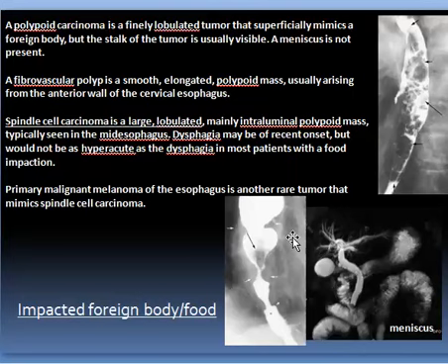Come to this one here. The esophagus is dilated. There is some filling defect here, which could be considered a foreign body or a polyp. But definitely here you see shouldering. So this is a region of neoplasm.